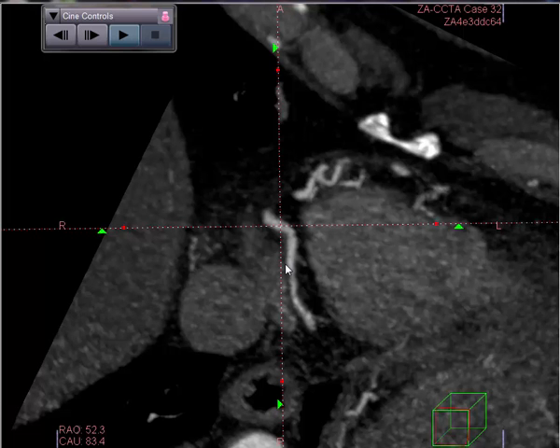So this 48-year-old man has really quite serious plaque disease. He has a possibly borderline, possibly obstructive lesion in the small D1, but otherwise there are no major obstructive lesions. Decisions as to what to do with this patient are sometimes difficult. He clearly needs very advanced, aggressive medical therapy. He must stop smoking. As to whether or not we need to evaluate that D1 lesion, a stress test may be appropriate in this case to absolutely rule out any issues, but many clinicians would just say that's a small vessel and probably medical therapy would be appropriate at the present time.